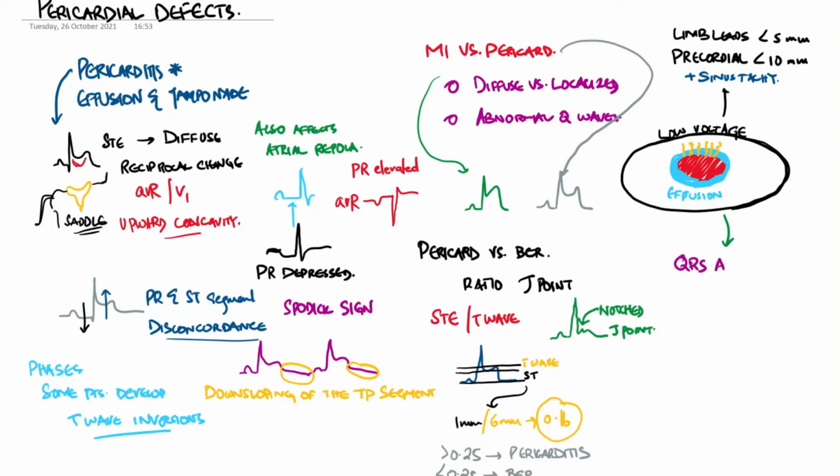One more finding that I want to talk about is QRS alternans. QRS alternans is basically what happens when there is beat to beat variation in the axis of the heart. This is what an ECG will look like when you have electrical alternans.